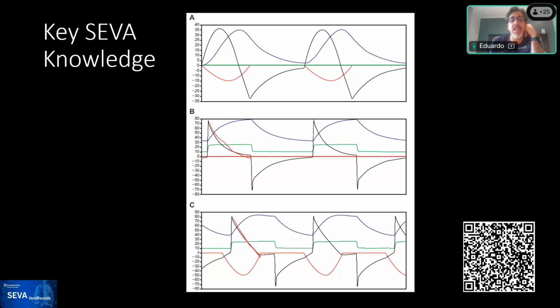So the patient is exhaling during inspiration. Now, some ventilators let you do that, and some don't. Some ventilators essentially close the valve and don't let you exhale during the inspiratory time if the flow tries to go negative. This becomes evident here as you see the volume reach the top, and then it starts decaying, and it decayed below the peak.